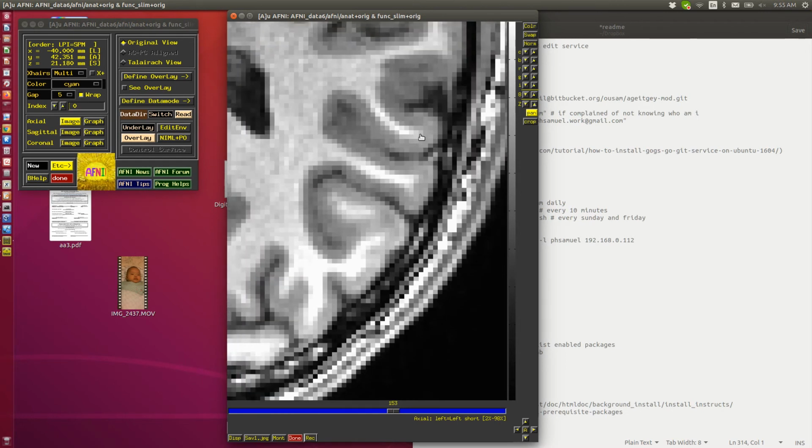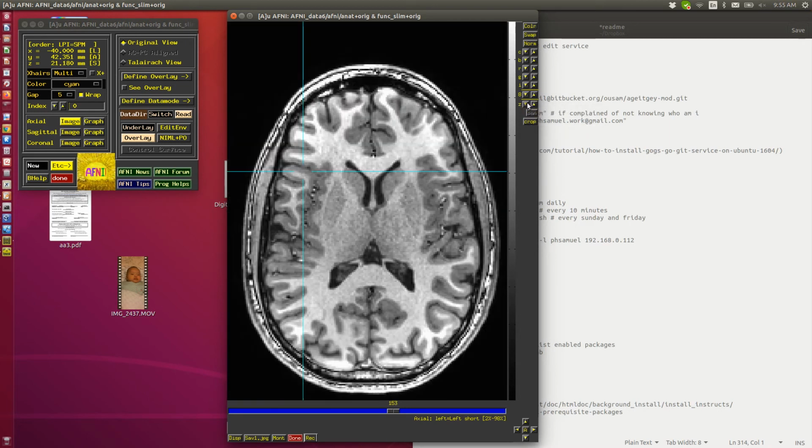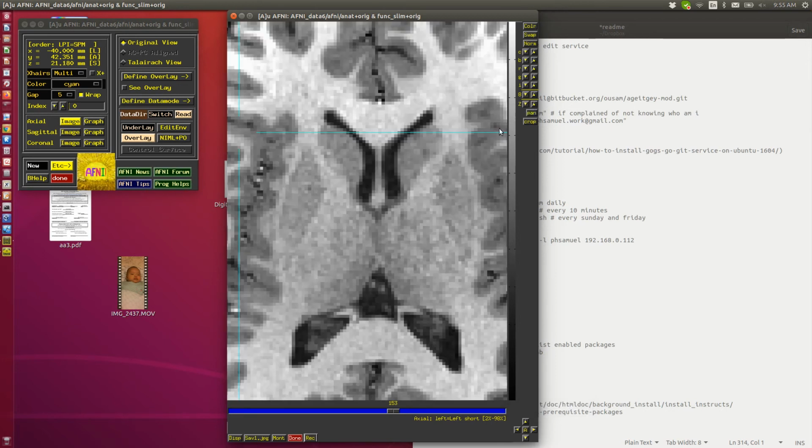So you may want this kind of thing. And then if you zoom all the way back out down to the one-to-one zoom, then the pan button is disabled. It's still there, but you can't click on it. It won't do anything.